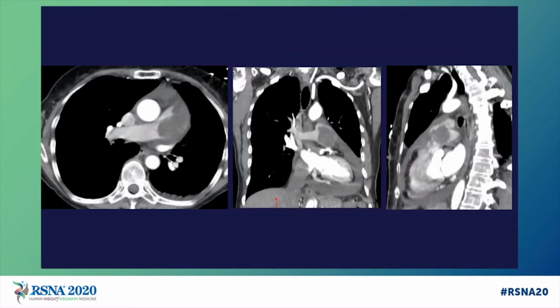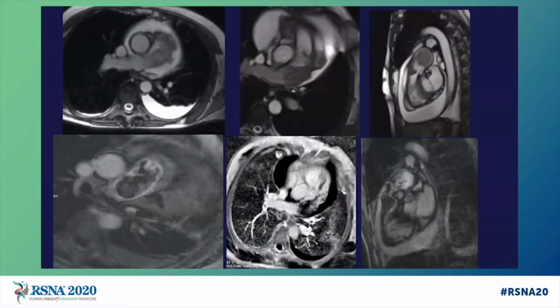So an example of a patient that we evaluated who had a filling defect, reminding us that MR can be useful for the evaluation of a filling defect or embolism. The question arose as to what this mass represented. The patient received an MR and we were able to give contrast, and you can see that it's fixed to the pulmonary artery wall. There is some enhancement, and this would be very atypical for a bland thrombus, and as you would expect, ended up being a PA sarcoma.